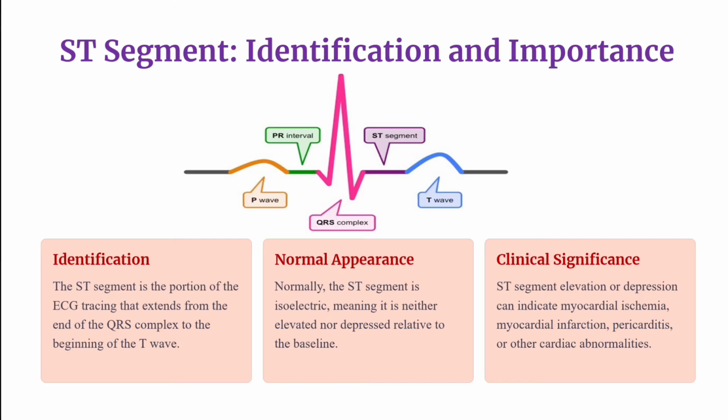It represents early ventricular repolarization. Under normal circumstances, the ST segment is isoelectric, meaning it lies at the baseline. However, elevation or depression of the ST segment can indicate conditions like myocardial ischemia, pericarditis, or myocardial infarction.